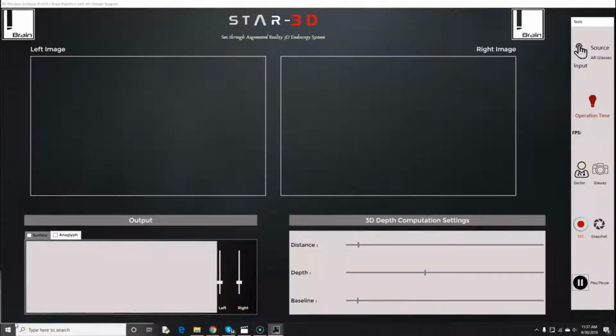I will now show you what each icon is for. Input is the top one. Here you can load image file, load video file, and your vision device. These are the 3 main ones that you will use in the input section.